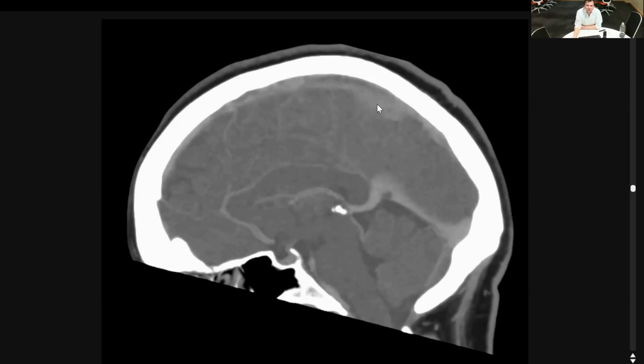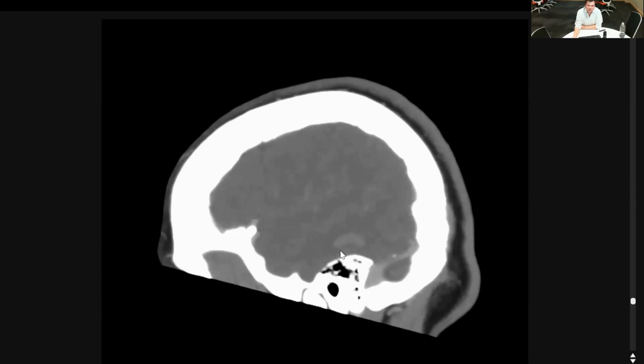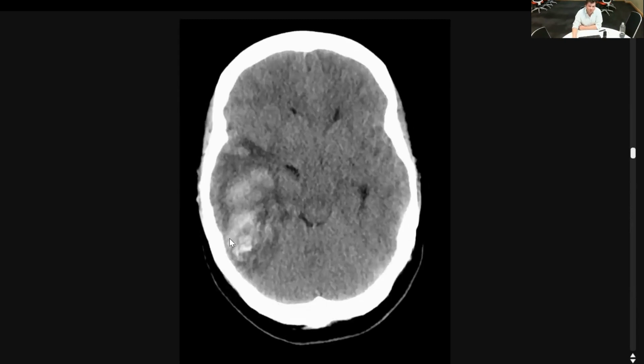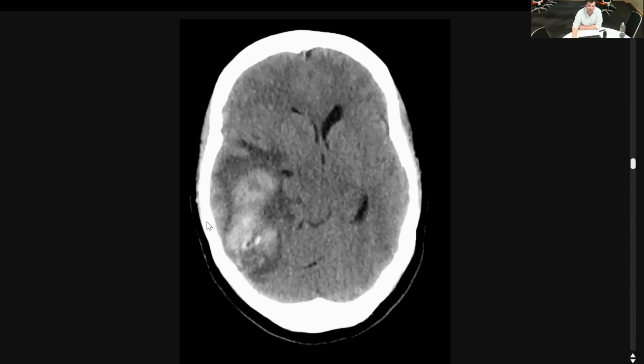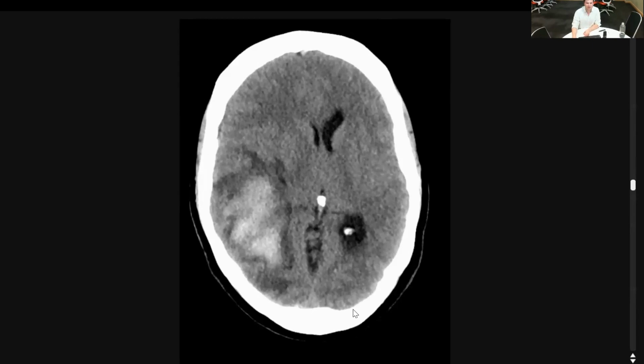Anticoagulation. So these patients should get anticoagulated, and when they've got a bleed, that's obviously going to confuse things, but that's something which the stroke team and the neuro guys have to take a lead on. But we have to pick up the bleed, have to pick up the venous sinus thrombosis. This was the same patient. So it's something that we have to bear in mind, but it's not our decision to make as radiologists. But if you get a patient who's deteriorated, scan them again, because this is what's happened to this patient. Big extension of their hemorrhage and lots of that edema around it.